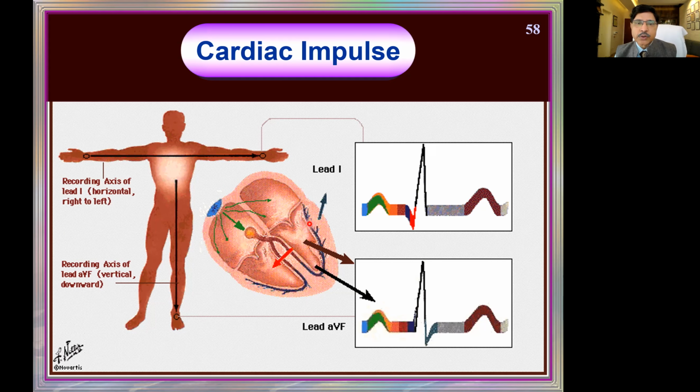For the ventricles to contract, the AV valves must be closed, then only the semilunar valves will be open and the blood will go into the outflow tract. So for that reason, there is a slight delay between the closure of the AV valves and the opening of the semilunar valves. And that delay is the PR interval or the delay in the AV node. So from here to here, the QRS is starting here. So from here to here, 0.12 seconds for the atrial activation and 0.08 seconds for the delay there.